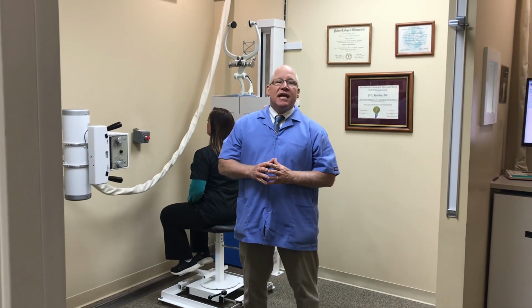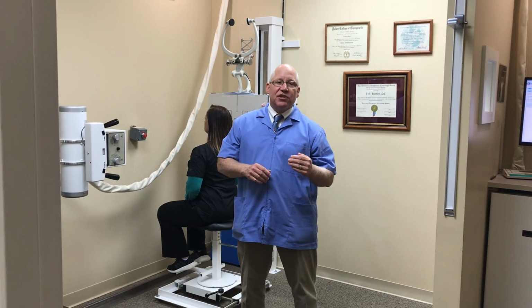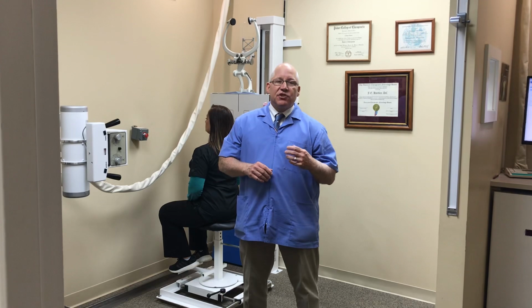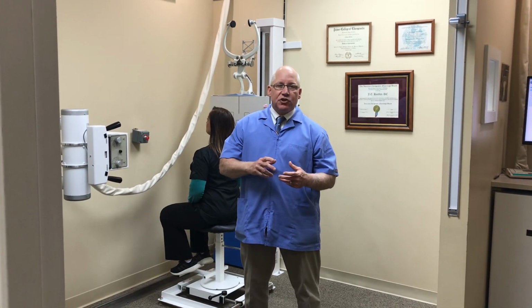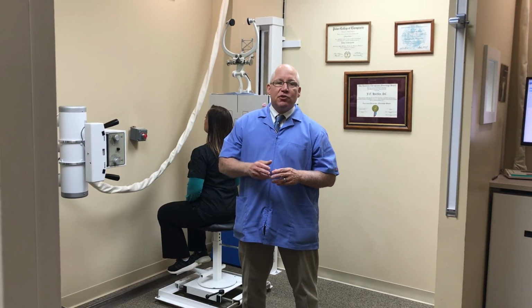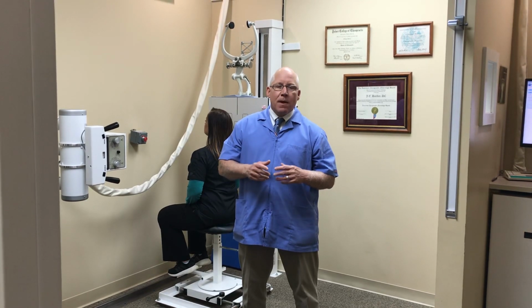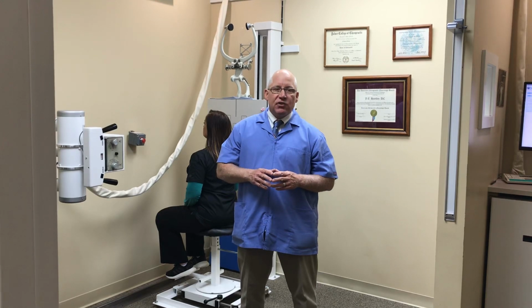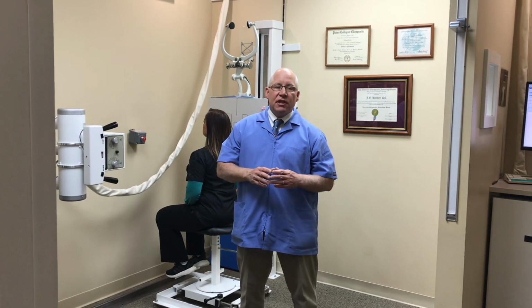And today we're going to be talking about detecting ligament damage in the Flexion Extension Cervical X-ray and the Alar Cervical X-ray. This is very important because there can be undetected ligament damage or segment instability at occiput, C1, C2 that may result in headaches, neck pain, numbness, facial symptoms, many neurological conditions that are undetected. These can be caused from either birth trauma, fall on the head as a kid, car accident, things like that.